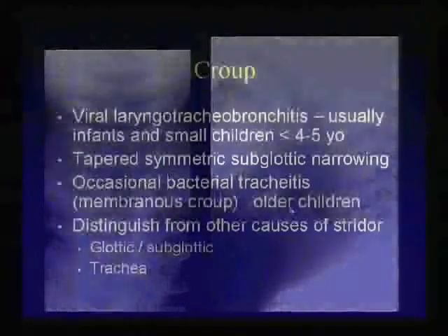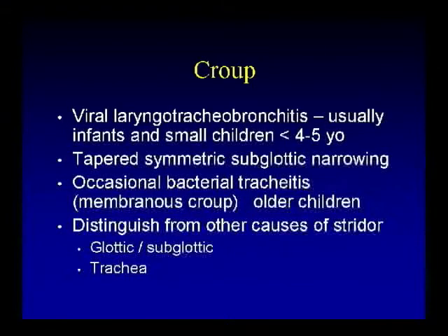Moving down the airways, you can see there's narrowing of the subglottic trachea. If you imagine a pencil point or a steeple, this would be a pretty characteristic steeple sign, a condition we all know as croup, or laryngotracheobronchitis. Here's another frontal view, which is more characteristic. It's easier to make the diagnosis on the frontal view, and the lateral view is often misleading because the narrowing is more side to side than front to back. But in this case, there is some narrowing in the subglottic trachea, and occasionally during inspiration you'll see ballooning of the hypopharynx. It's a fairly common disease.